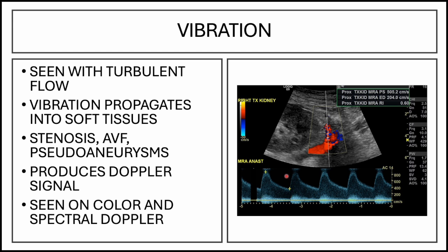This is consistent with the soft tissue vibration. So this is analogous to that soft tissue vibration that we see on the color Doppler image. This is what it looks like on the spectral Doppler image.